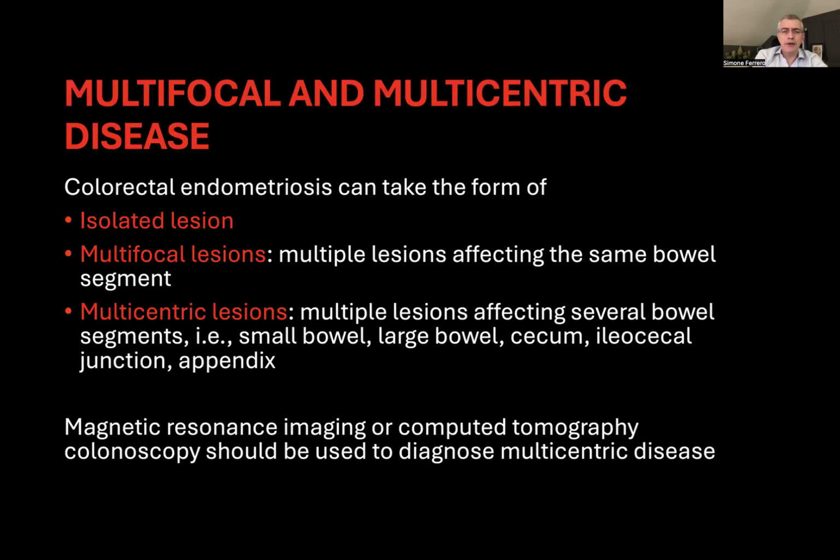When we identify a colorectal nodule, we must assess if it is an isolated lesion or if we have a multifocal or multicentric disease. It is important to define these two terms. Multifocal lesions are multiple lesions which affect the same bowel segment, while multicentric lesions are multiple lesions which affect several bowel segments, such as the small bowel, the large bowel, the cecum, the ileocecal junction, or the appendix.